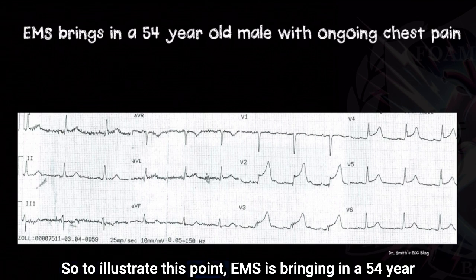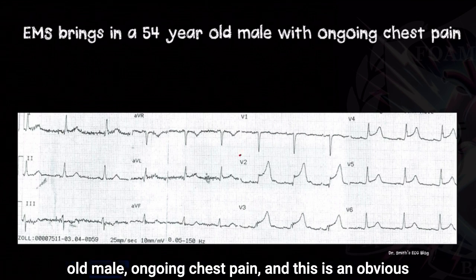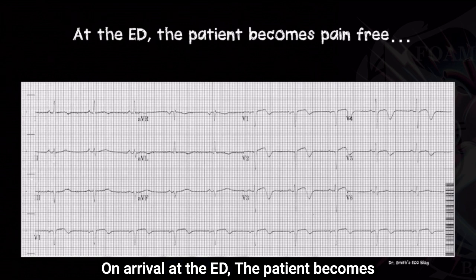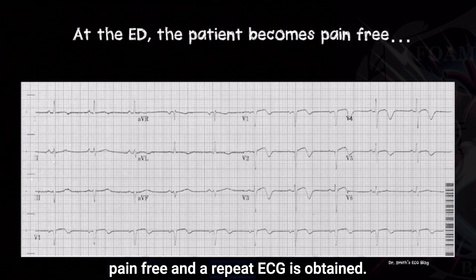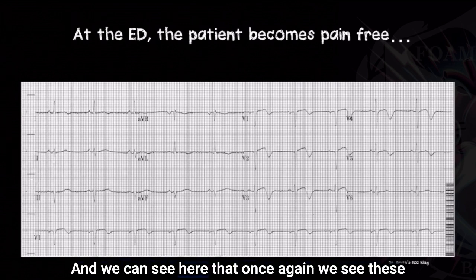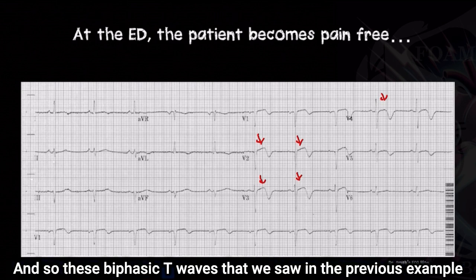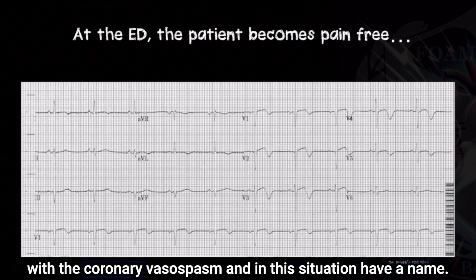So to illustrate this point, EMS is bringing in a 54-year-old male with ongoing chest pain, and this is an obvious anterior septal MI with elevation in V2, V3, and V4. On arrival at the ED, the patient becomes pain-free and a repeat ECG is obtained. And we can see here that once again, we see these biphasic T wave patterns in V2, V3, and V4.